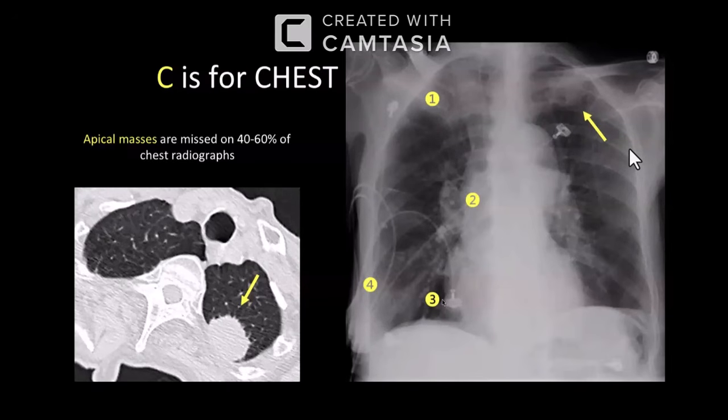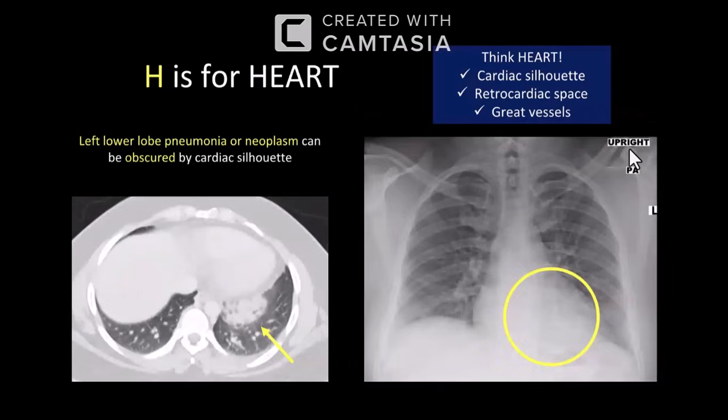And of course, the lung bases adjacent to the paracardiac region. This is an elusive area, so you have to be very careful. And of course, pleural-based pathologies you have to mention in the report if there are any.